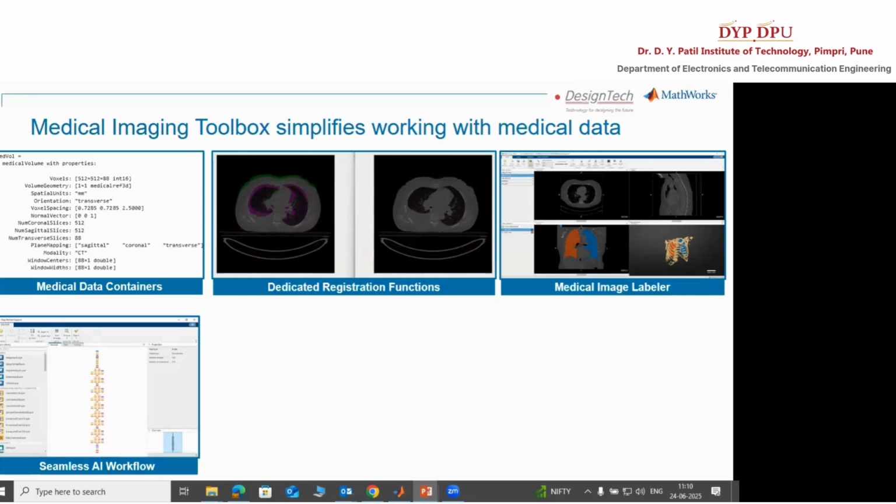I will show how to plot a confusion matrix for simple feature data, starting from the basics, and then quickly jump to deep learning as well: how to implement it in 10 lines of code, what pre-trained networks are available in MATLAB, how to access them, and the role of the Deep Network Designer.